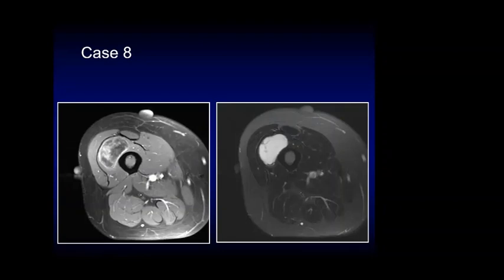In the thigh, high signal intensity on fat sat, enhancement after the post contrast. يعني اللوكيشن nearly lateral aspect of mid thigh I think.